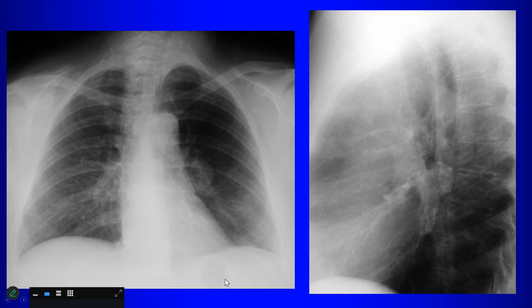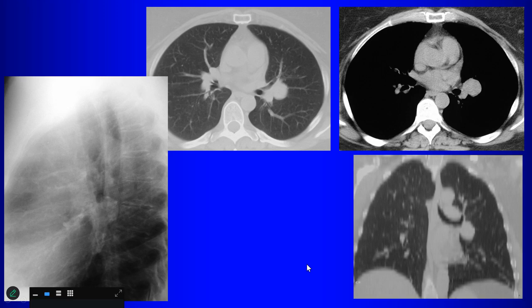How about this one? Again, subcarinal lymphadenopathy, and looking at the left hilum, maybe some left hilar lymphadenopathy. Yeah, there's this abnormal opacity here over the left hilum. There's a nice donut sign over there, so there's something wrong here, right? So this patient needs to go to CT. It turns out they have a tumor in the lung that's actually projecting over and giving you that donut sign. But still, the donut sign is abnormal, okay? And so this patient needs to go to CT.